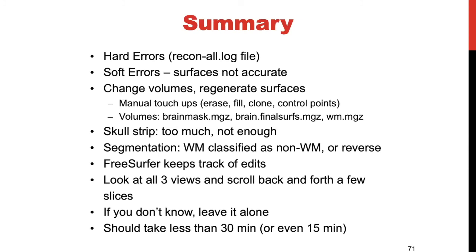You can also use different editing modalities, such as erasing voxels, filling voxels in, cloning voxels, or adding control points. The volumes you will most likely use are your brain mask and your white matter. You also have the option of using brain.finalsurfs.mgz, but that one is not so common. I think that's for special purposes.